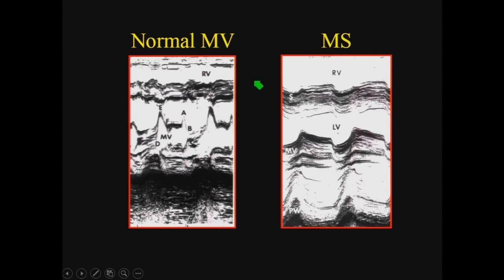We are going to cover a few classical appearances of M-mode. Some of them are really history, but this is important to know, and in many cases also very helpful. And I just want to remind you that measuring against time, M-mode, kind of, is what you have when you record spectral Doppler. But in spectral Doppler, we don't have people like Dr. Wiggers that come and say, this is nothing. I mean, because it's something. All right.